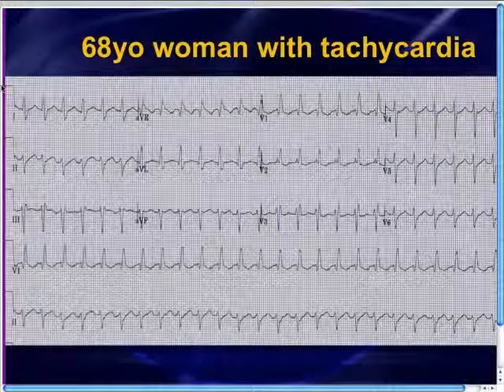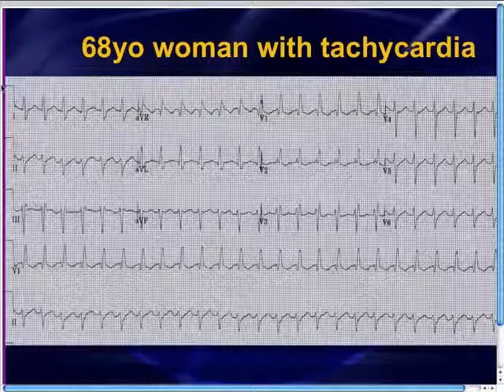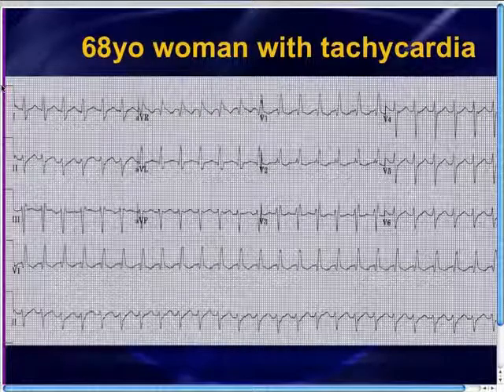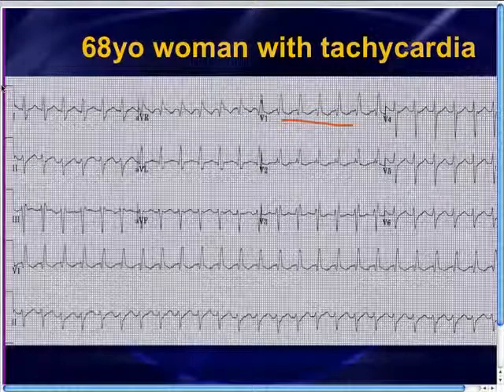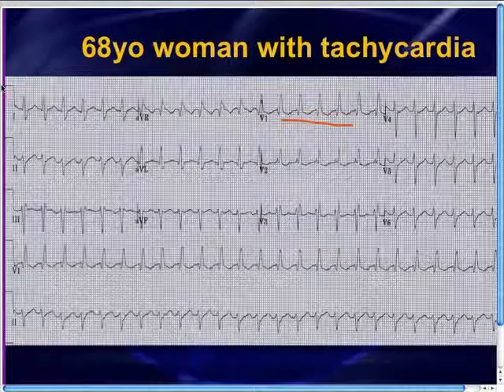Supposing she came in with a tachycardia of 170 or 180, well, 220 minus 70, there's no way a 70-year-old woman can have a sinus tachycardia of 170 or 180. Certainly extremely unlikely. So that's one pearl to keep in mind, which in this particular case is not that helpful. Again, taking a look at V1 and looking at lead 2, looking everywhere, it's really difficult to see any specific flutter waves.